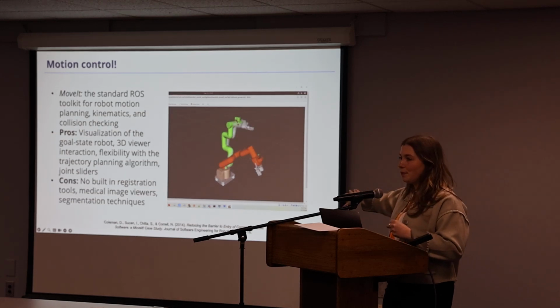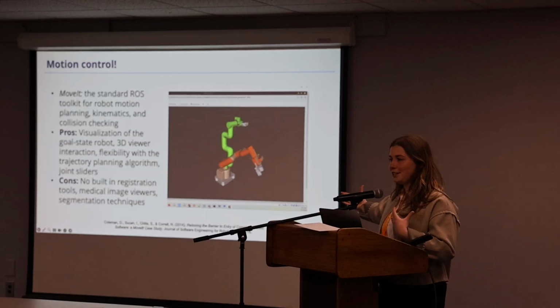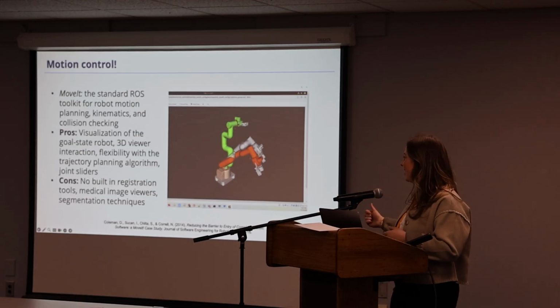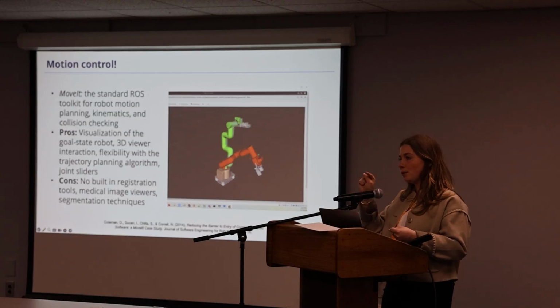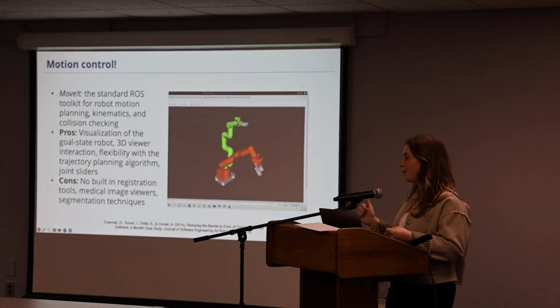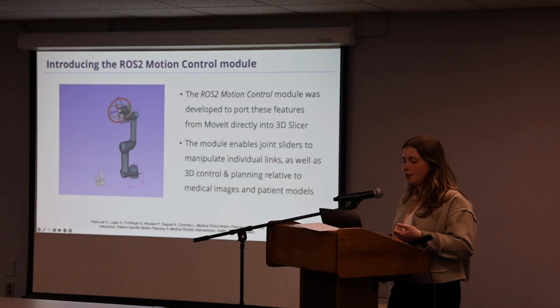But this is the viewer for MoveIt. I find it pretty hard to work with. So you can imagine that getting a surgeon to look at this might be difficult. One thing it also doesn't have, which we noticed while we were developing this, is a slider to go through the trajectory and stop at individual time points. So yeah, when you're going to medical images, it's not the best tool.